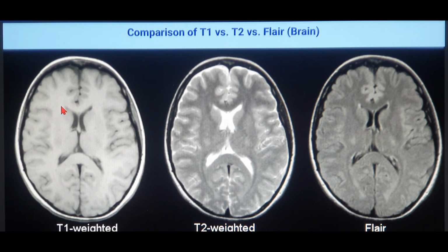And you can actually see the brain parenchyma with the sulci and the gyri and the ventricles as well. You can see them on the CT scan as well, but not that clearly and not in much detail. So the first thing is you have to locate which scan that is, and you have to look for the brain parenchyma and the ventricles.